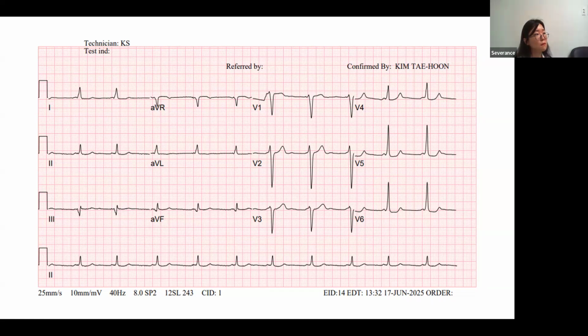Yesterday you also told me that we suspect the anterior location, but how can you explain the negative delta wave in lead 3 and AVF? If it's negative in 3 and AVF, then actually it's coming from posterior. So posterior and inferior, moving upward, and that is why it will be negative. It's really coming inferiorly.